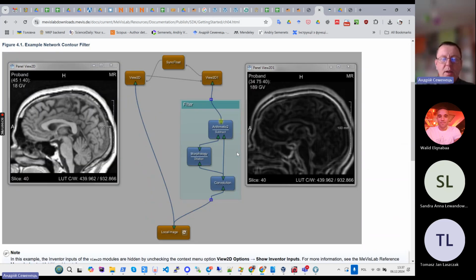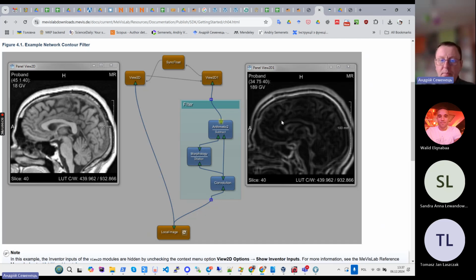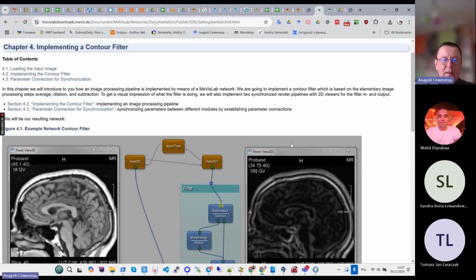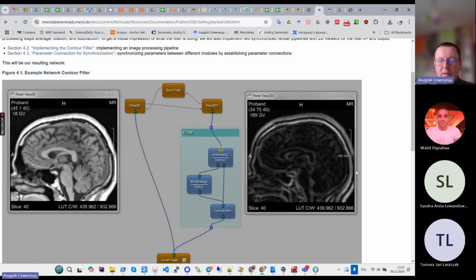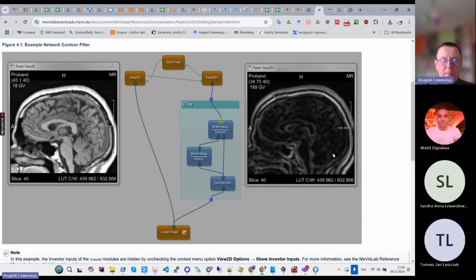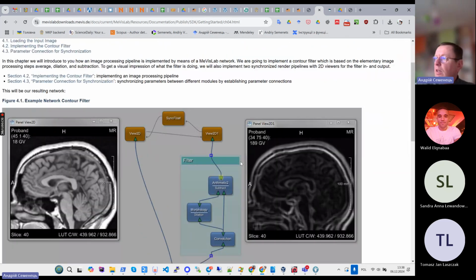In this case you have to create a filter which will make some selection of the image and demonstrate borders between different types of tissue with different characteristics. In this case, we need these elements: convolution, morphology, and arithmetical analysis.